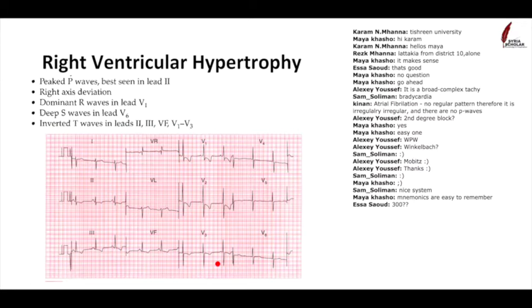Alternatively, you can have right ventricular hypertrophy. And remember we said which sides of the heart we're looking at. So up here, this is on the front of the heart, but the front of the heart is the right ventricle. If you look at the way the heart sits in the chest wall, the right side sits anteriorly on the front. So here we have a big positive wave in V1. It's not broad like it was in the right bundle branch block, but here it's just really positive. And that often happens in right ventricular hypertrophy.